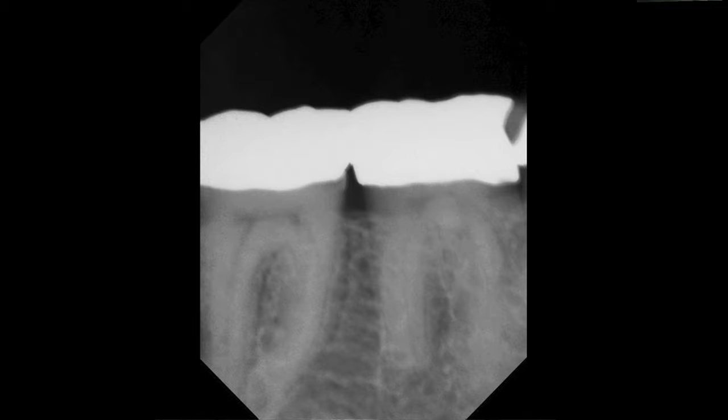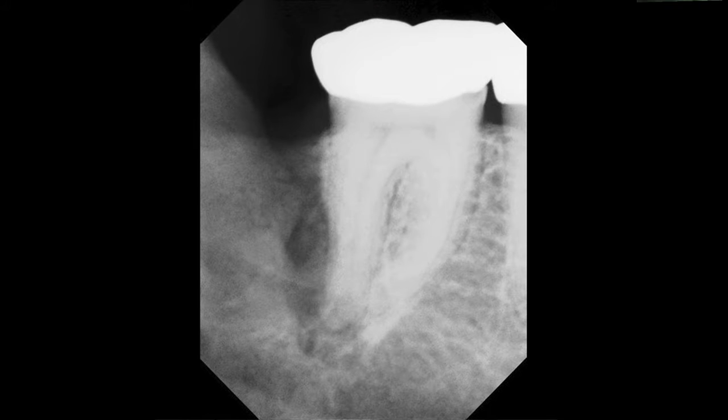This radiograph illustrates an important point. You notice that the apices of this tooth are not on the film. If you are going into the pulp, you need to have an image of the entire tooth. So we take another image, and here you see a massive lesion on the distal of this tooth and around the apex of the tooth, and actually this case has a neoplasm which we picked up in this film, and this patient actually expired within 6 months after this film was made. So it's very important to have the entire tooth on the film.